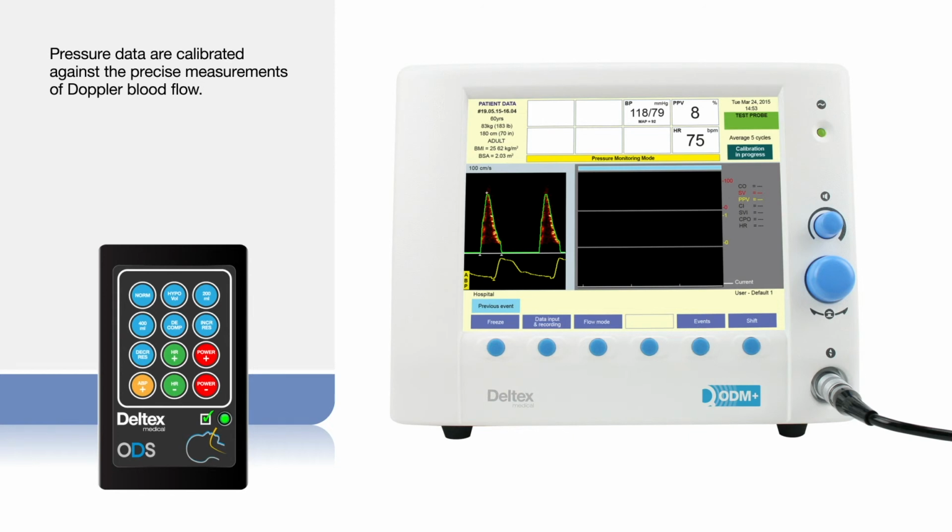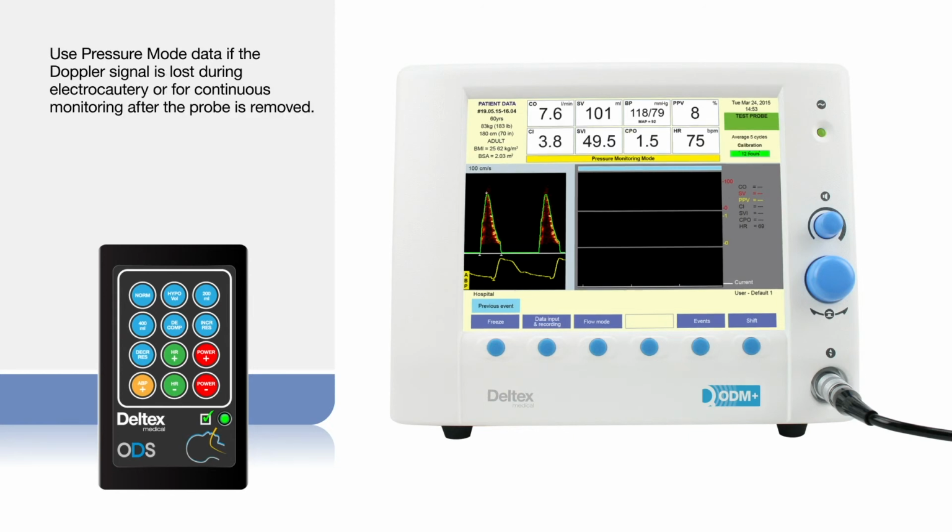Derived data can be used in pressure mode should the Doppler signal be lost due to diathermy or during continuous monitoring after the probe has been removed. If you toggle between flow mode and pressure mode, you can see that the data are consistent.